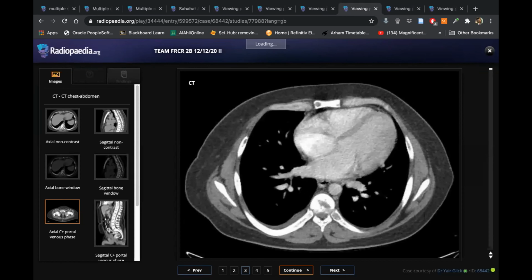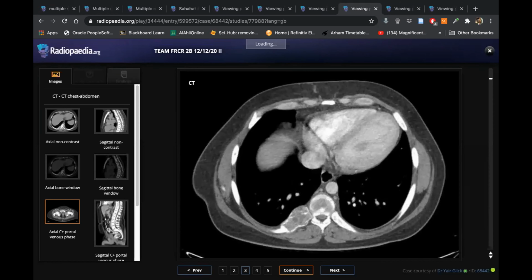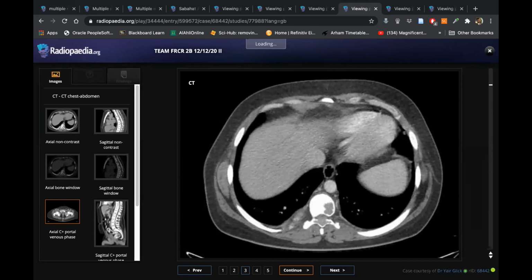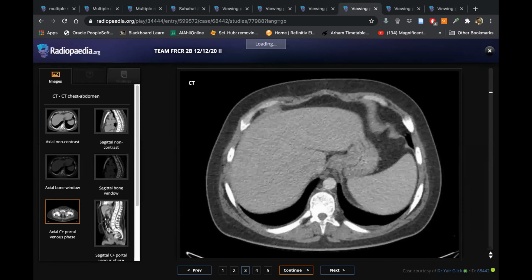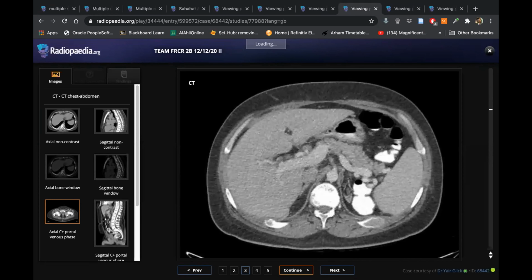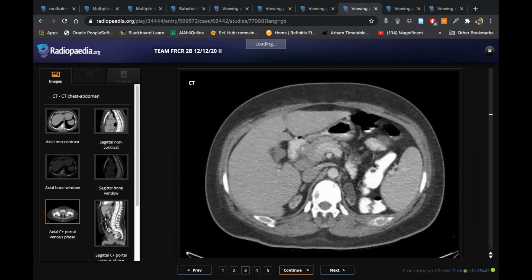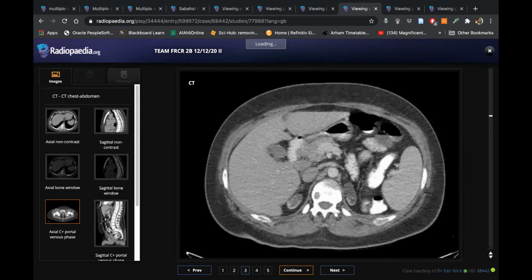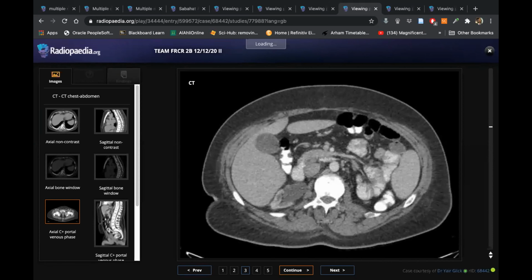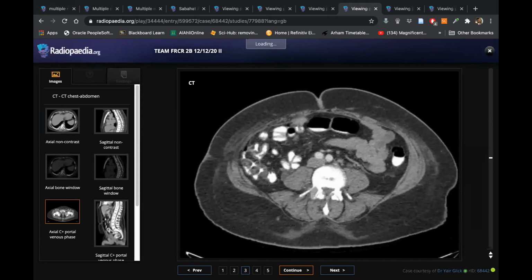Go ahead. Okay, so in the CT scan, I can see multiple expansile osseous lesions at first look in the vertebrae as well as in the ribs at the costovertebral junctions. Excellent. In the posterior elements as well as in the multiple vertebral bodies. Both kidneys are very small, atrophic with parenchymal thinning, scarring and bilateral prominent renal pelvises.